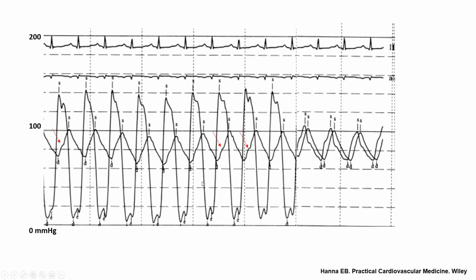All right. I will give more technical tips. Before I go further, I'll show you this simultaneous LV-aortic pressure recording in a patient with severe aortic stenosis. In the cath lab, we like peak-to-peak gradient, which is the easiest for us to grasp. So we look at this peak and this peak. Every interval is 20 millimeters of mercury, according to this scale. So this patient has a peak-to-peak gradient of approximately 40 millimeters of mercury, which puts you in the severe category.